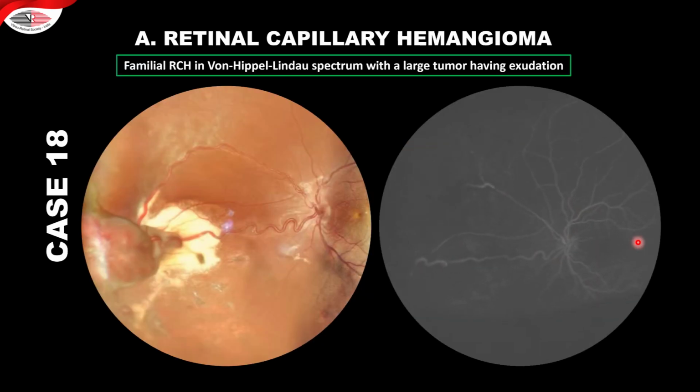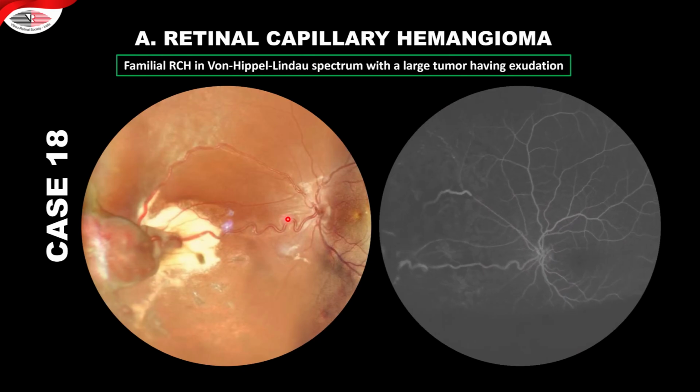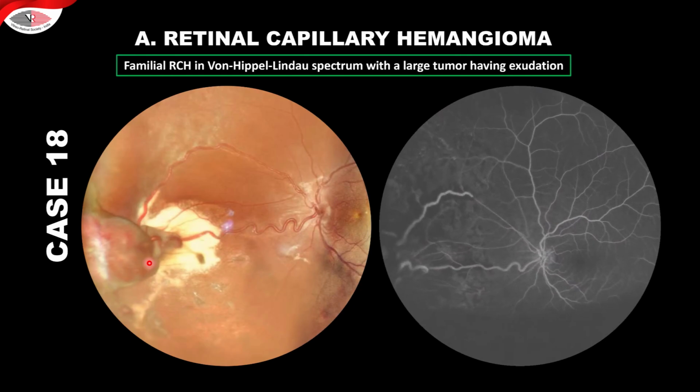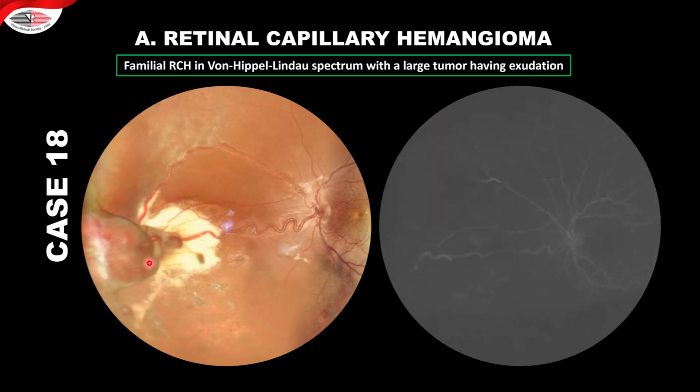This is a case of a young girl with a large von Hippel hemangioma seen in the periphery with the classic tortuous vasculature of supply, and this is the angiogram of this patient. And we did treatment of this patient in 2, 3 different stages of cryo, laser, anti-VEGFs, at about 15 to 20-day intervals, 2 or 3 sittings to ablate the feeding vessel, so that the further growth of this tumor stops, as the feeding channel is ablated along with the tumor.